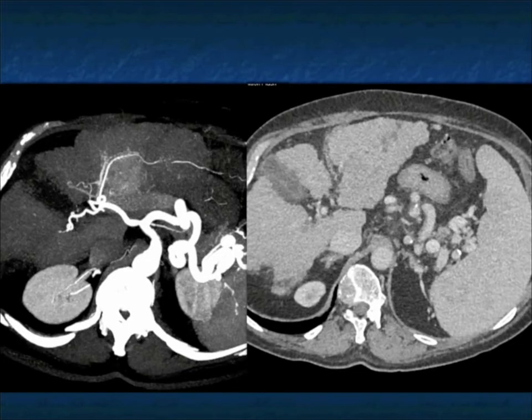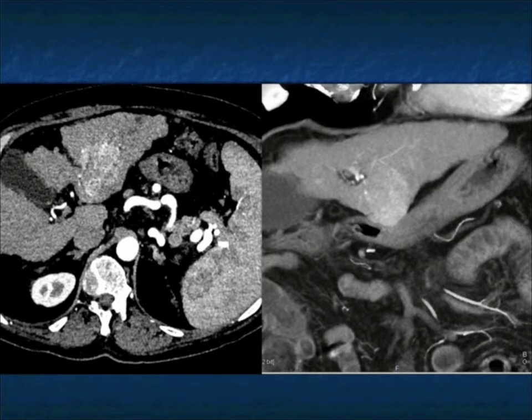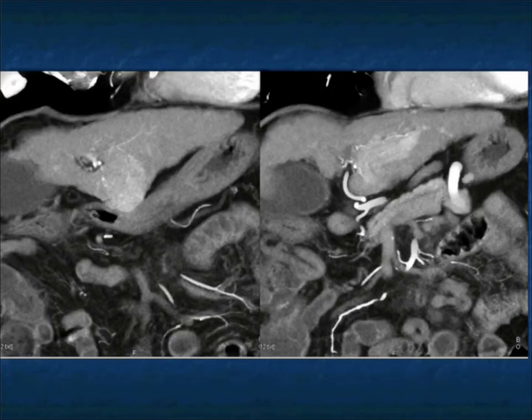You can see the tumor a little bit better defined, and you can see that in the venous phase imaging, the tumor is hard to see. Hepatomas, if you only have venous phase imaging, can easily be missed. That's why the articles I quoted in the beginning make the point you need arterial phase imaging or you can miss things. Again, here's that arterial phase with both 3D, very nicely showing you the patient's tumor.